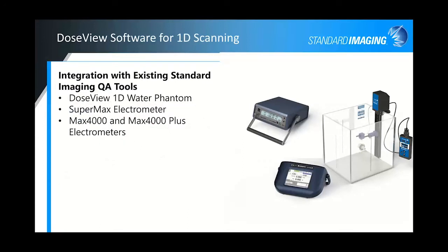It has full integration with our existing tools, obviously our 1D Phantom, but it can also be utilized with both our Max 4000 and Max 4000 Plus electrometers, so both generations of those, as well as our Supermax 2-channel electrometer.